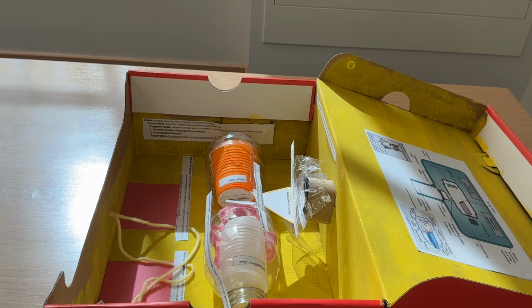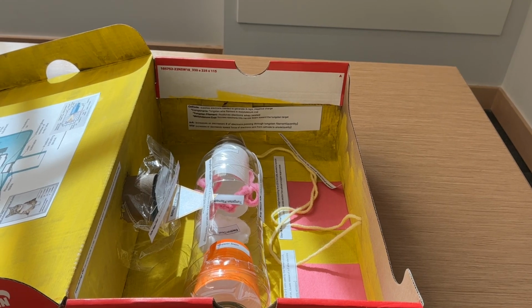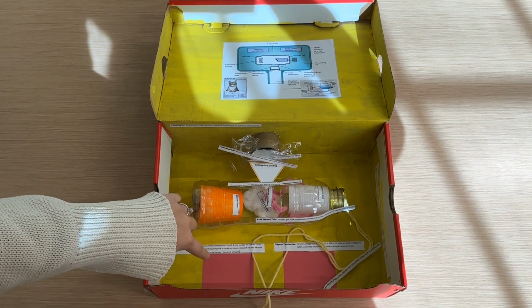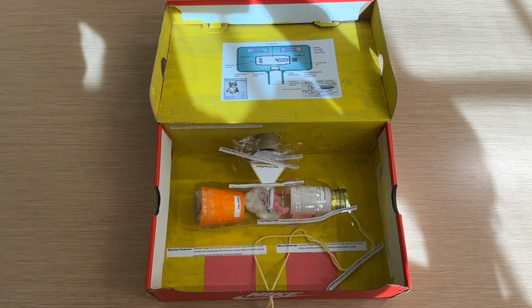The anode converts electrons into X-ray photons and contains a positive charge. The cathode supplies electrons needed to generate X-rays and contains a negative charge. This is the step-down transformer, and it decreases the voltage from the wall outlet and heats the filament just enough to form an electron cloud.